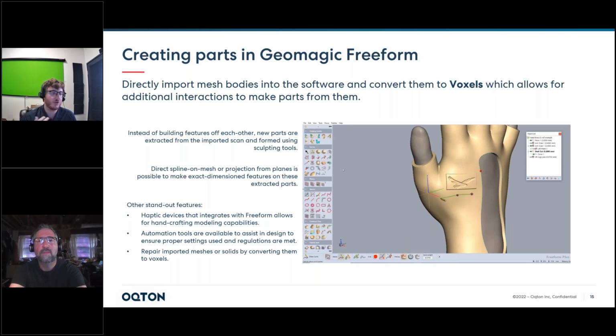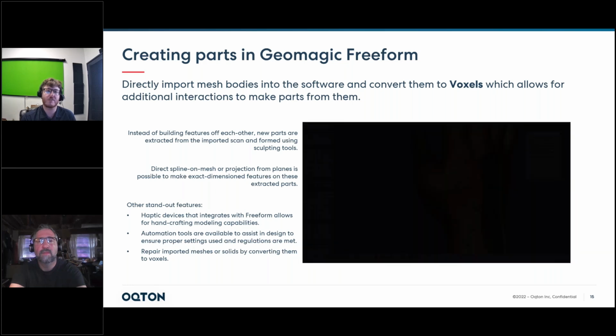And just creating extremely high-end form-fitting parts to these scans is what you would want to be able to send to a printer when you are working a lot in the medical field. You want that extreme high fidelity, that ability to teach others on how to make them as well. That Dynabot tool that was shown is very popular, to be able to just hand to a new user and say, hey, follow these prompts. You can recreate the parts very easily. It's very easy to follow along with those pictures and basic coding. So really handy in that sense.